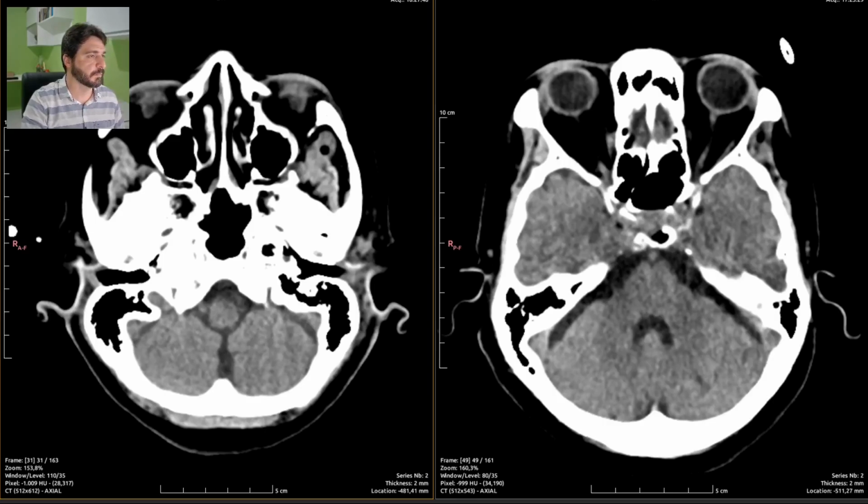So we are done. Yeah, just let me read it once again to see if I have mistyped anything. So, yep, anterior communicating artery, it's left side hematoma. Yep.